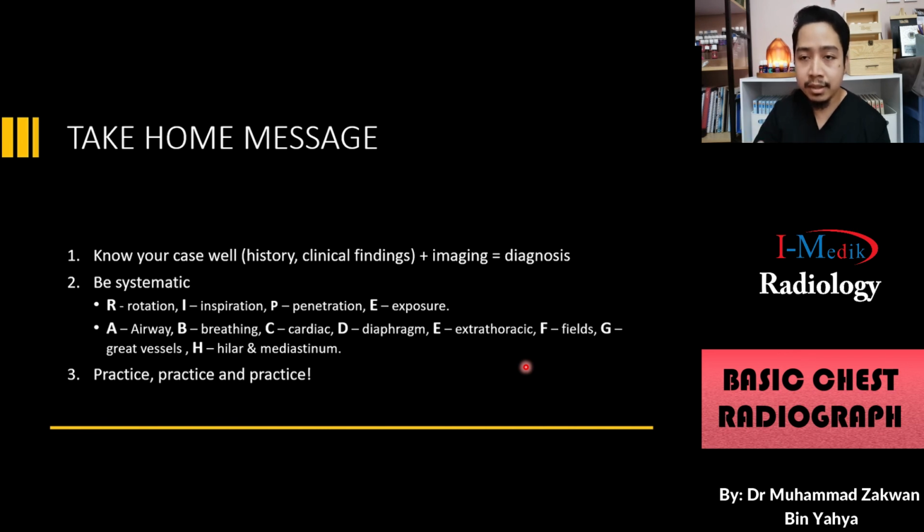Every time you see a chest radiograph, even if it is a normal one, okay, because the more normal chest radiographs you see, the easier you will pick up the abnormality, because if there is an abnormality, you already know, oh, this is not a normal finding there. So the normal chest radiograph is also important, okay, obviously the practice. So that's why you need to practice, practice, and practice.